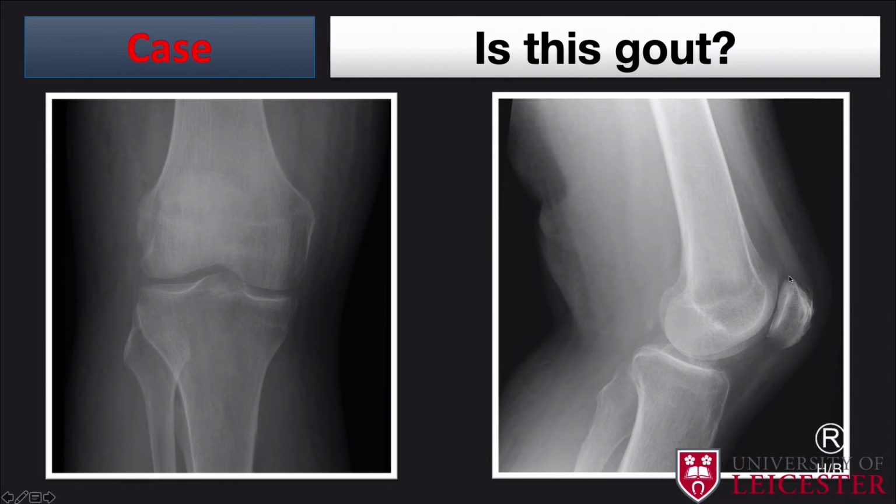Just because I didn't cover anatomy in the previous lecture, and I'm sure you all know this, these are the femoral condyles. You've got two femoral condyles, that's why you've got an overlap here. This is the distal femur up here and the distal femoral shaft. You've got the patella. Here you've got the proximal fibula, which articulates here with the proximal tibio-fibular joint. This is the proximal tibia.